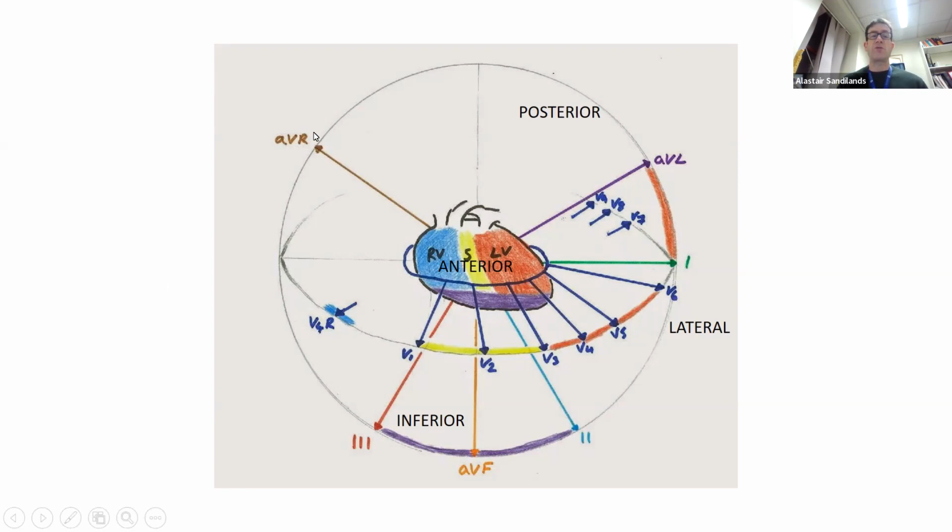Remember, aVR is at the top right. Mostly everything beneath aVR is showing negative, so it's going away. But sometimes you have to think if there is ST elevation in aVR, that might be a reciprocal change of what's going on around the heart here. So it's still an important lead to look at when we've got ST-T wave changes.